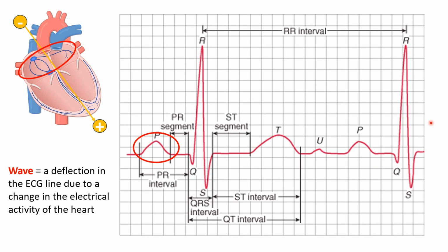There's a slight delay in left atrial depolarization compared to right atrial depolarization, and that's because we have the SAN located in the right atrium, and the impulse has to travel to the left atrium via Bachmann's bundle, which I'm illustrating here.